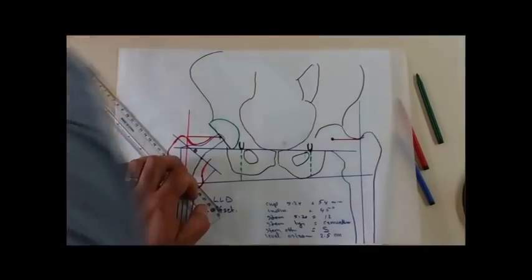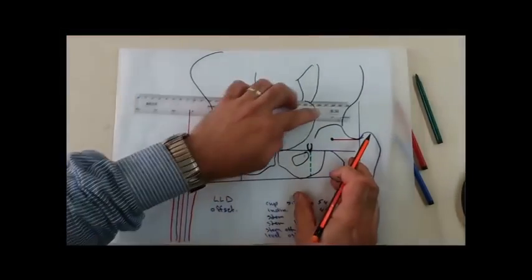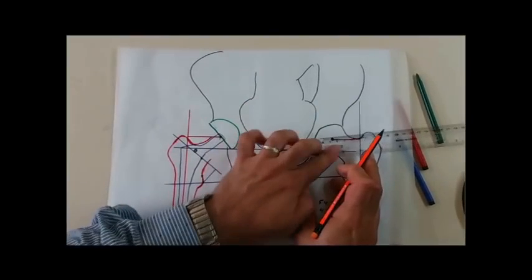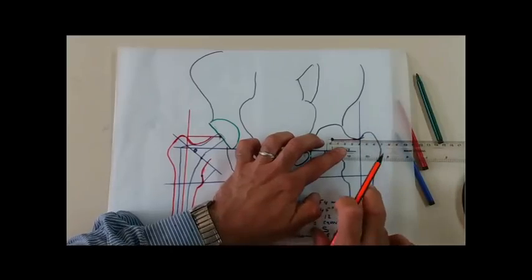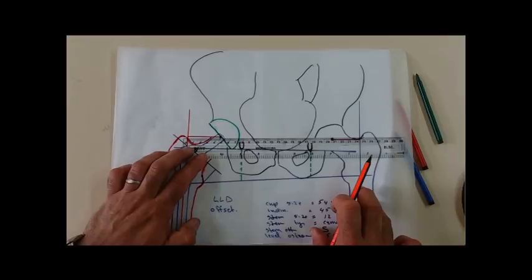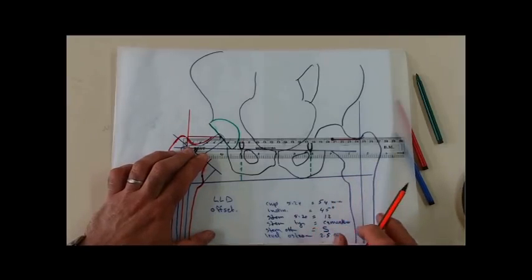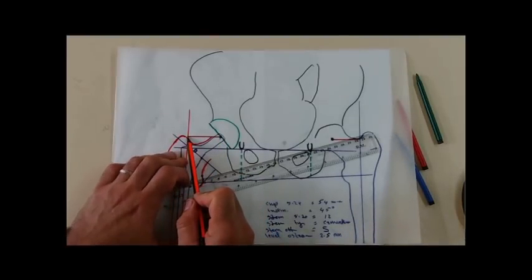This is the left offset. I measure it by ruler. In this case, it is around 4 cm, femoral offset. While in the replaced part, it is 5 or maybe 4.7 centimeter. So there is an increase in the medial offset, which is not acceptable.